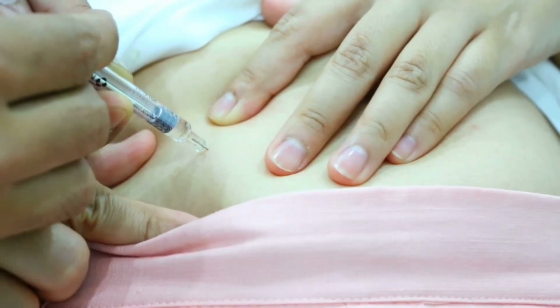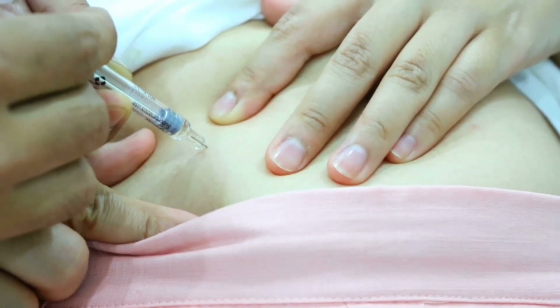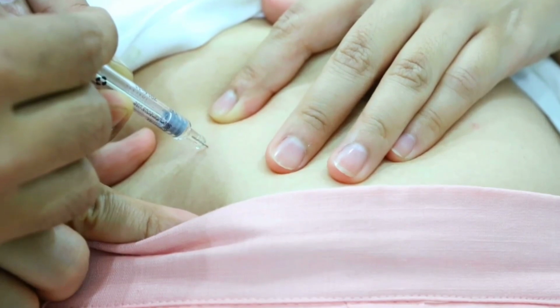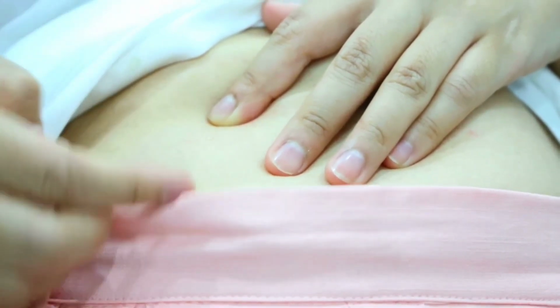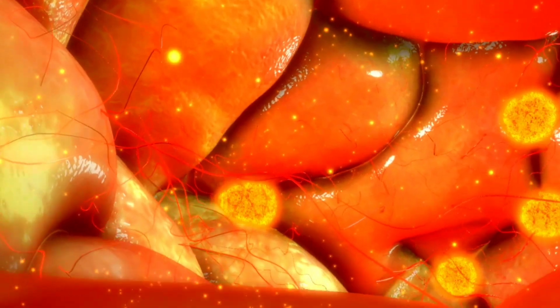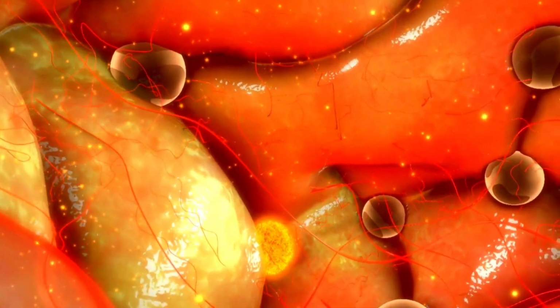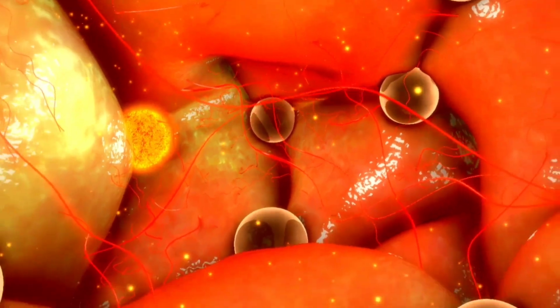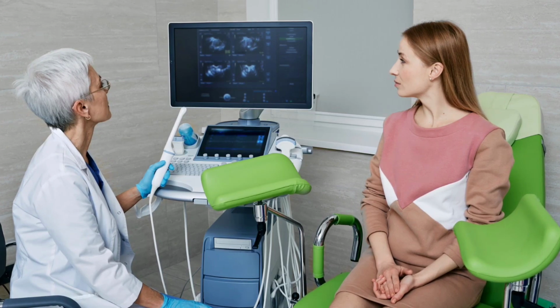The different stages of in vitro fertilization, IVF. First step: stimulation. The objective of stimulation, a hormonal treatment administered by injection, is on the one hand to obtain the simultaneous development of several follicles and on the other hand to be able to collect oocytes before ovulation. This treatment is monitored appropriately by ultrasound scans and hormonal measurements. When the follicles are mature, the triggering of ovulation is prescribed at a precise time, which also determines the time of the follicular puncture.